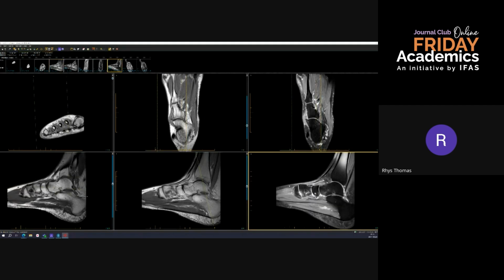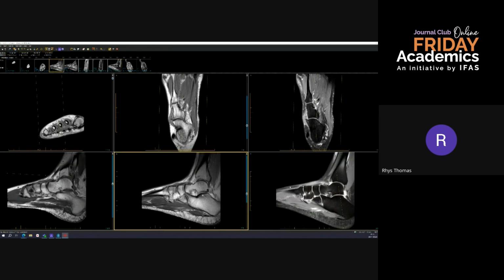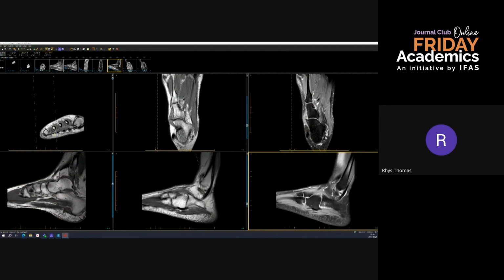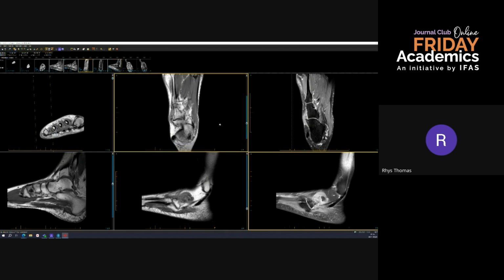in keeping with a little avulsion fracture. As we move then slightly more laterally, we've got the bifurcate ligament, and again, here is the navicular branch of that ligament, which is intact, but we've just got edema in the cuboid component here, and then we scroll through to the lateral margin of the calcaneal-cuboid joint, where we've got a dorsal calcaneal-cuboid injury and probable previous avulsion.